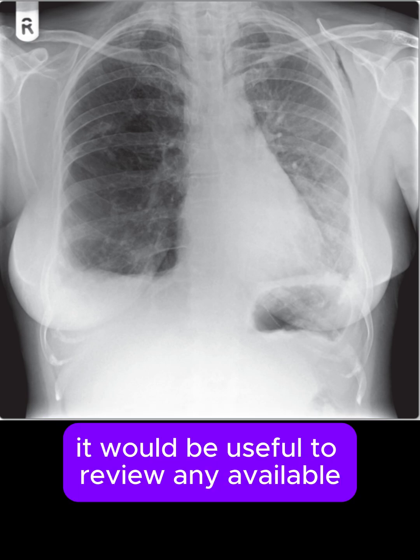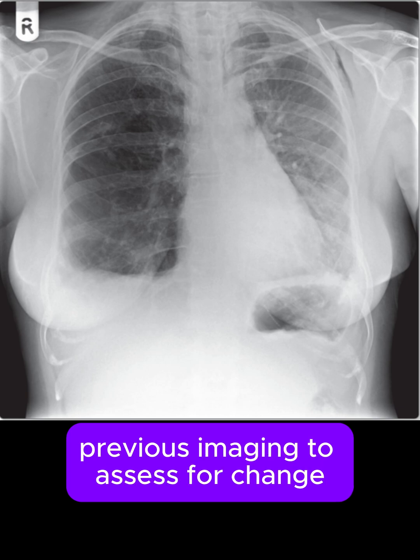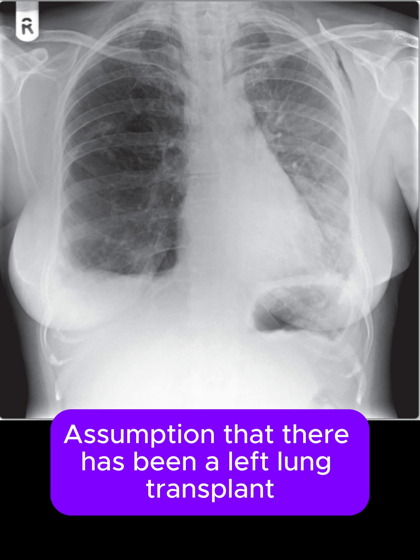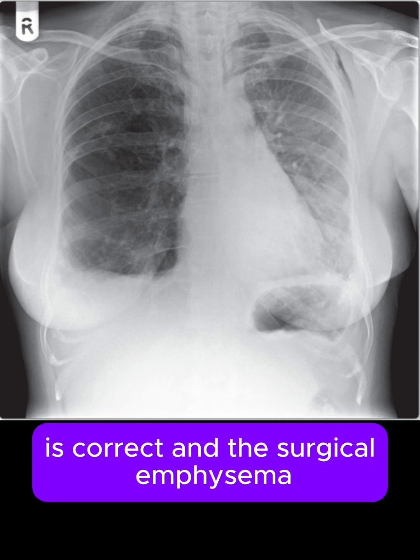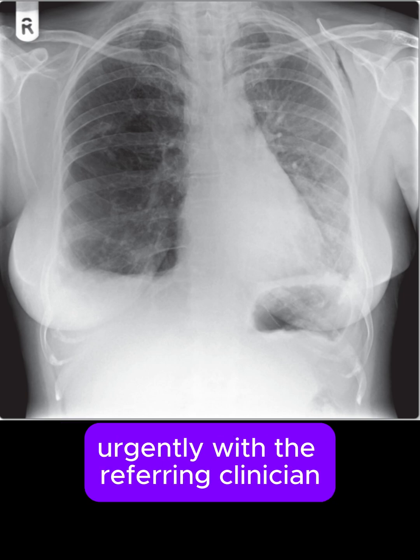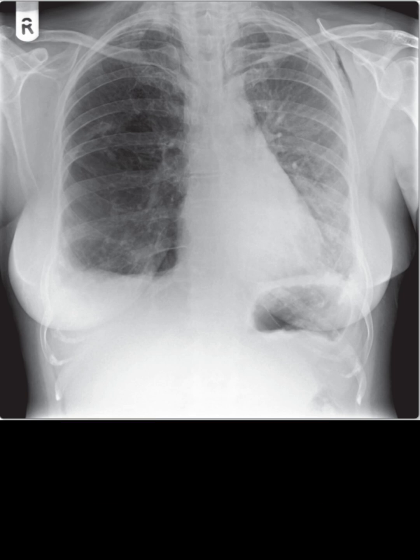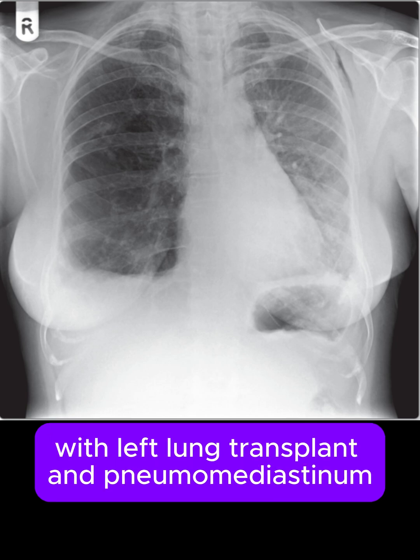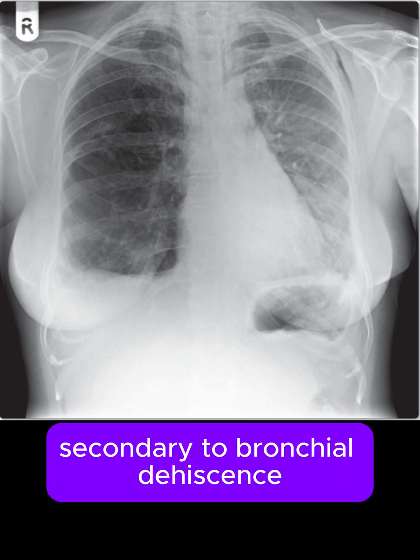It would be useful to review any available previous imaging to assess for change, but if the assumption that there has been a left lung transplant is correct, and the surgical emphysema and pneumothorax are new findings, this case should be discussed urgently with the referring clinician. So, our diagnosis is LAM with left lung transplant and pneumomediastinum secondary to bronchial dehiscence.